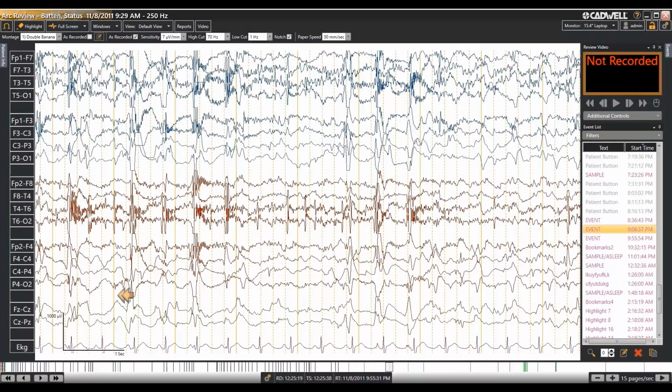That concludes the quick overview of different options for navigating through a study. For placing events in a study, managing displays, things like that, look for the video series on recording and review.